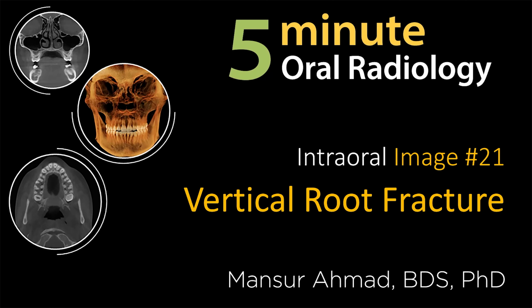Hello everyone, this is Image 21 for the Summer Interpretation Seminar course for D3 students at the University of Minnesota School of Dentistry. These images will create the basic knowledge for intraoral radiographic interpretation exercises in the fall and spring semester. In this video, we are going to review a single periapical radiograph to understand the radiographic diagnosis of vertical root fracture. To assist us in our learning, we'll also use a small field of view CBCT scan.